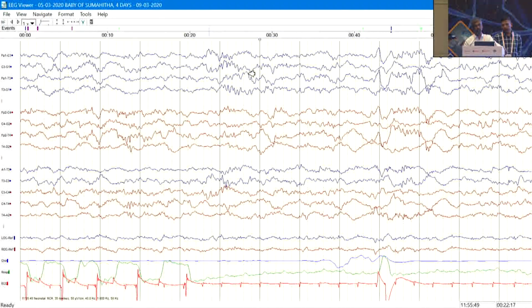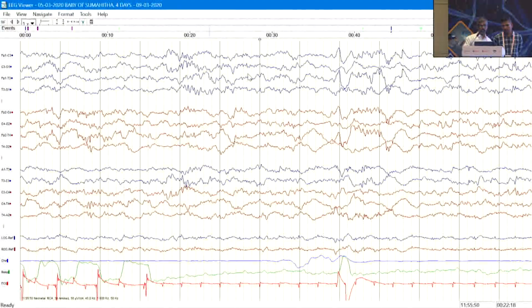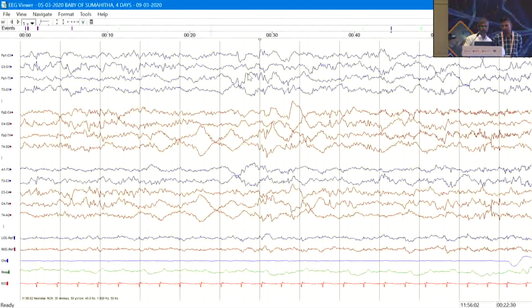Okay, so this is a marker of preterm baby. It's a normal finding, unlike the encephalopathy pattern, where the extreme delta brush is a pathological feature. Here it is a normal physiological feature. So you have to identify that delta brushes are there, which is a marker of prematurity. In a term newborn, you will not see delta brushes. So this is the only importance, and this is not abnormal for this age. So there are other examples here, delta brushes.